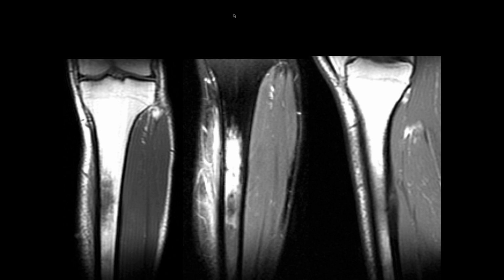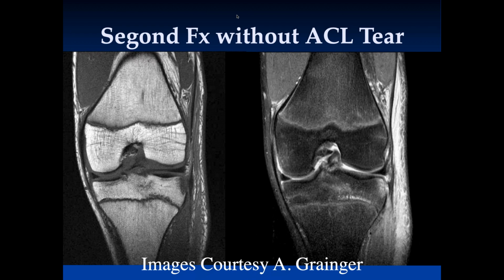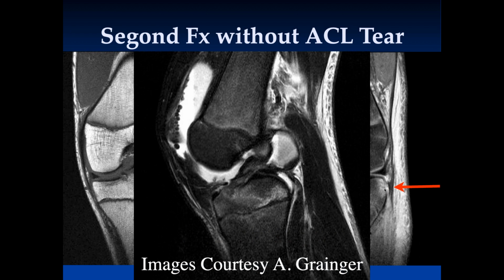Can you go to the previous case real quick? It almost looks like it's another IT band avulsion, but I could be wrong. That second picture, it looks like that's the IT band. Yeah. Okay. Because it's usually like the last one. It's probably IT band and anterolateral.